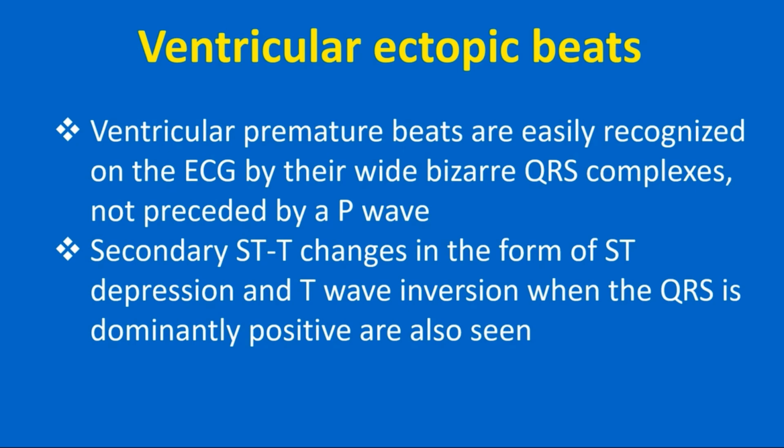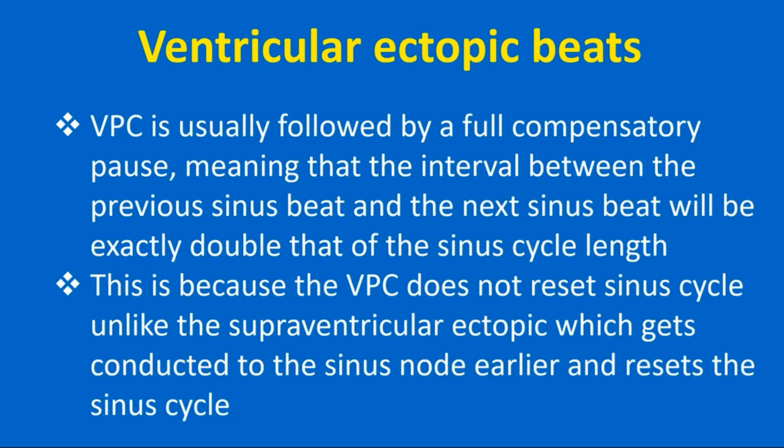Secondary ST-T changes in the form of ST depression and T wave inversion when the QRS is dominantly positive are also seen. VPC is usually followed by a full compensatory pause, meaning that the interval between the previous sinus beat and the next sinus beat will be exactly double that of the sinus cycle length. This is because the VPC does not reset the sinus cycle, unlike the supraventricular ectopic, which gets conducted to the sinus node earlier and resets the sinus cycle.